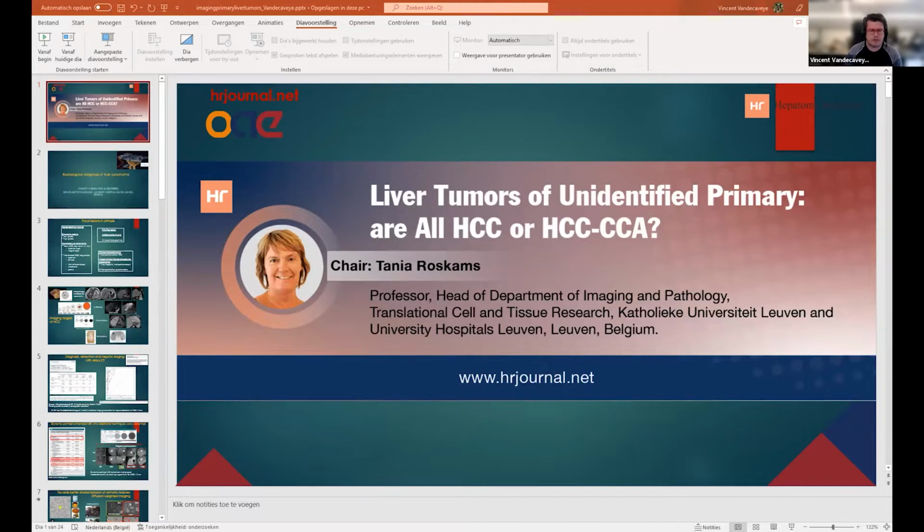We see a lot less metastasis, but we have, of course, to differentiate the malignant cirrhotic nodules from the non-malignant cirrhotic nodules. In the past, the FNH-like lesion was a problem. It is not a problem anymore for the simple reason that it is excreting the hepatobiliary phase contrast. So we have improved abilities to differentiate that from hepatocellular carcinoma.